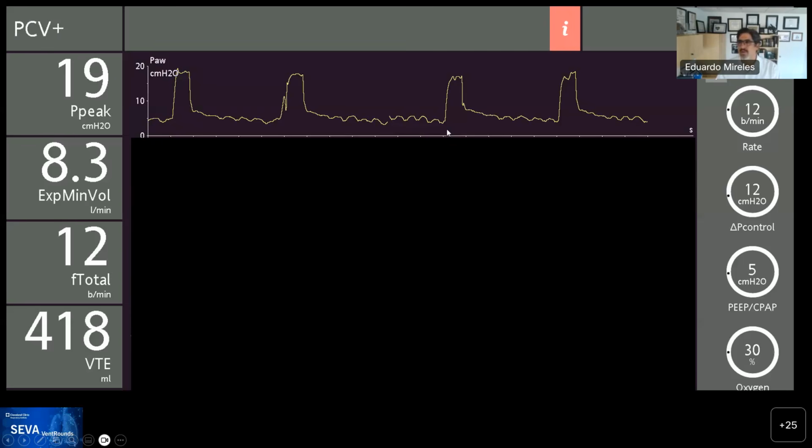So, maybe. If you look at it, it's getting each one of the breaths as the patient wants. It's getting the size that it is. So here's why, and this highlights the point. What we're controlling on this breath is pressure. So here's the rest of the waveform. And now it creates this stress on you, right? So a completely nice pressure waveform and a completely horrendous flow and volume waveform, where you actually cannot see the flow. That's what actually caught my eye as I was walking. The patient did not have any volume tracing, and it appeared now and then, and I said, oh, I gotta go see this.